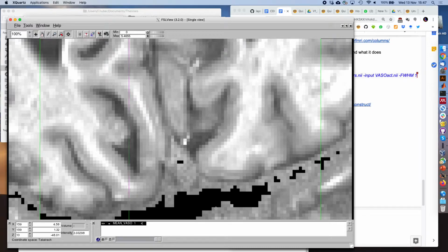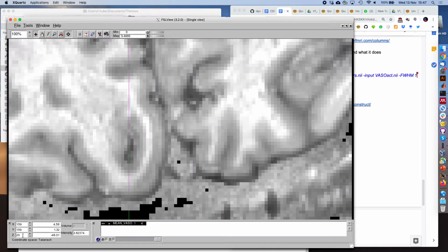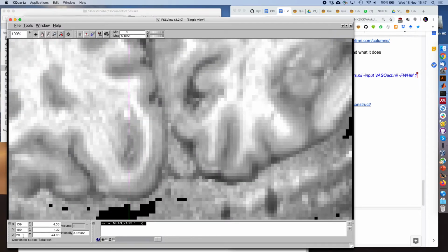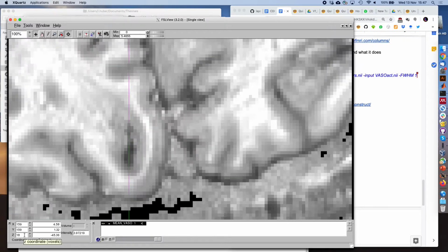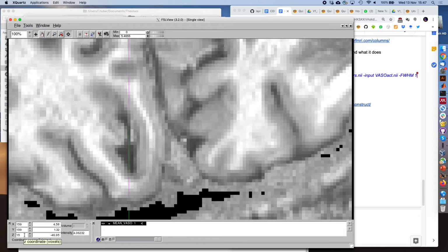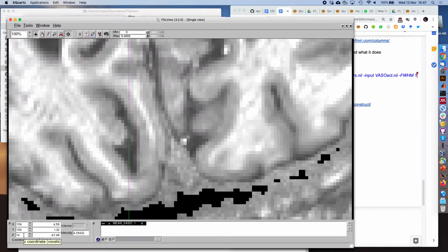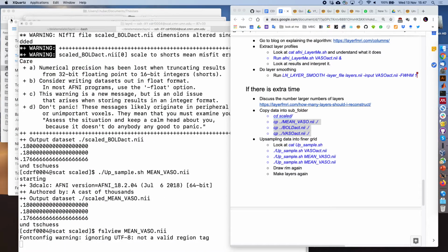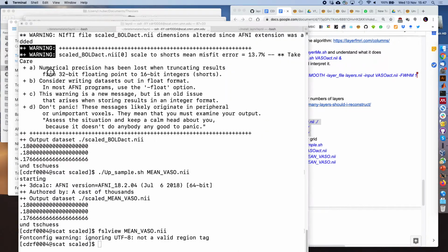And your headers need to be right, which they are never when you work with AFNI, or with tilted slices in AFNI. This is recorded, and I'm really grateful that the AFNI people help me a lot with everything I do. So there are some challenges with respect to tilted slices. Yeah, oblique slices are really a problem.